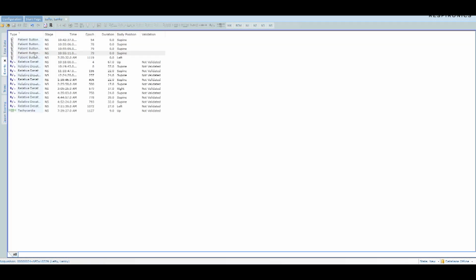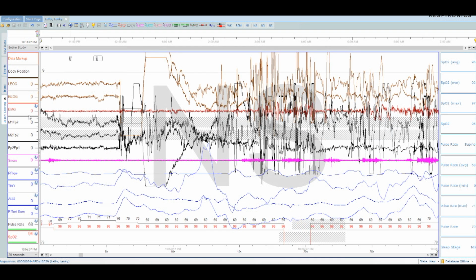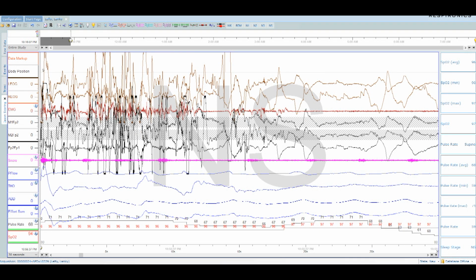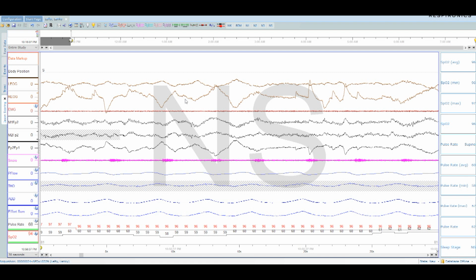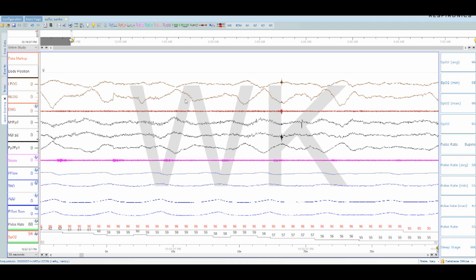So I've already deleted several of the automatic arousal events. I know I hit the button to go to bed, so this is going to be my lights out, and I just messed that up. So lights out. A lot of people like the scoring of this stuff. I geek out on it, and really the only reason I'm showing this, I should say 2 reasons. I actually fell asleep really fast, so I'm asleep right there already. If we go back, you can see alpha waves.